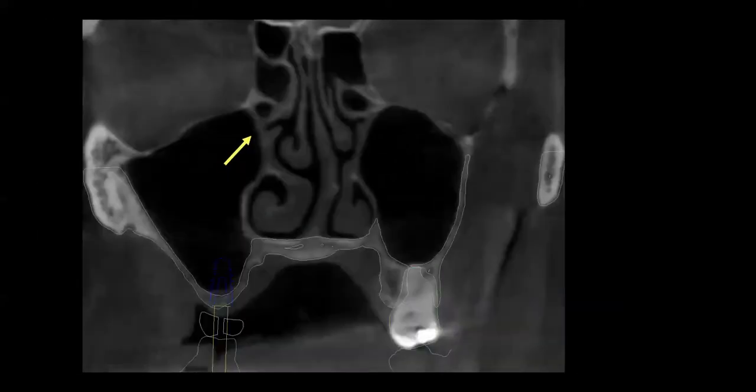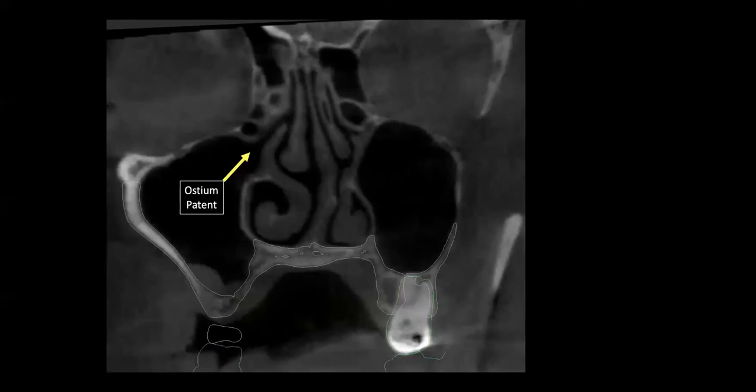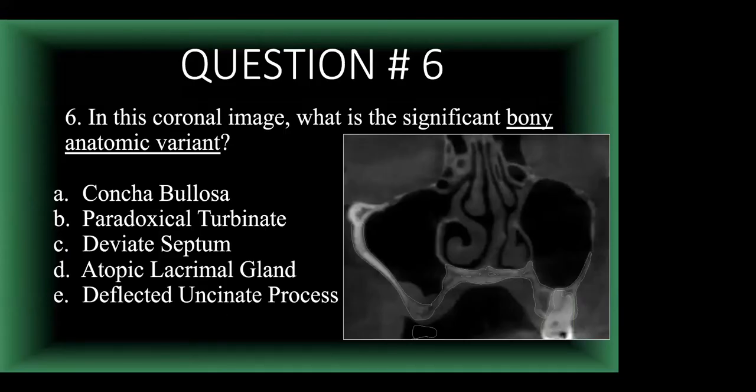So if we go back again, we start here, and if you click 1 millimeter in either direction, it'll get you to the point where you will actually see an opening or where you won't see an opening, and you want to verify that that is draining. Okay?